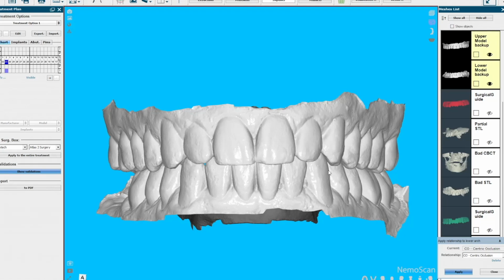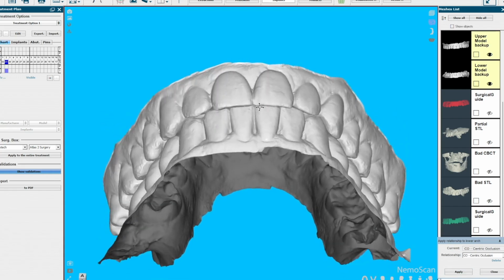Hello, my name is Michael Bradley and I'm with a new planning center, and in this video we're going to talk about how to make great STL files. So let's jump right into this.